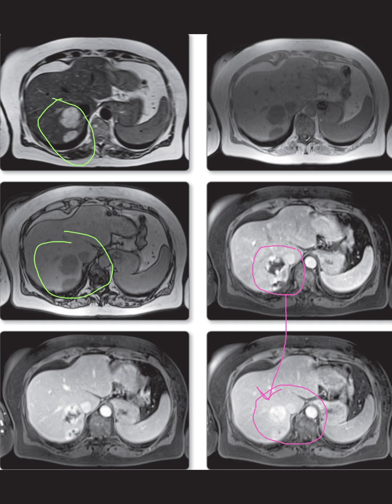To sum up, these imaging findings point to two focal lesions in an otherwise normal-appearing liver, with no signs of cirrhosis or other liver abnormalities. The native tissue signal and the post-contrast characteristics of these lesions strongly suggest they are benign. So what's our diagnosis here? Based on the imaging characteristics we've discussed, these findings are highly suggestive of multiple benign cavernous hemangiomas in the liver.